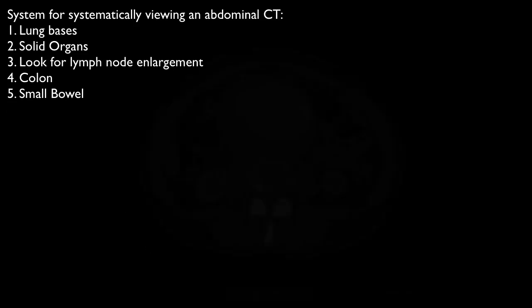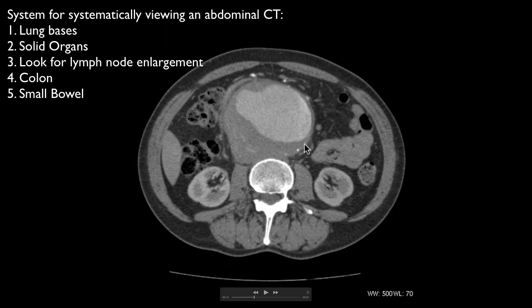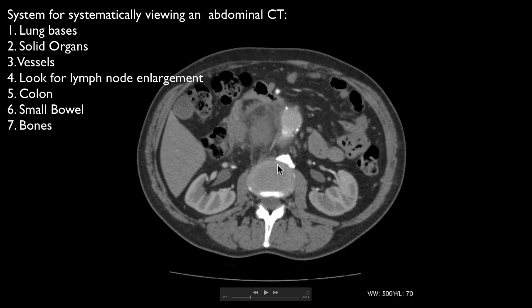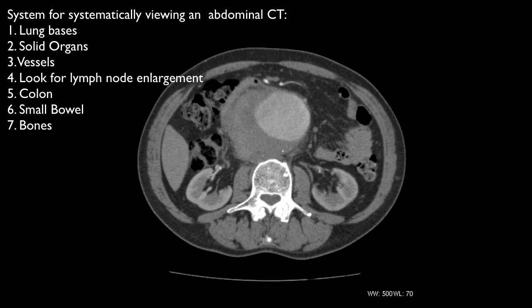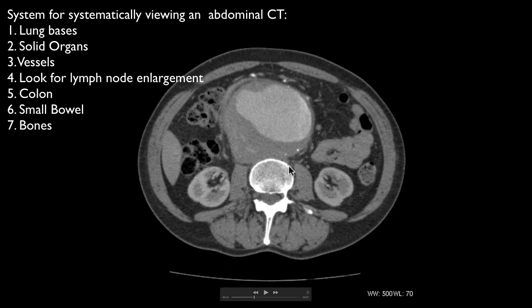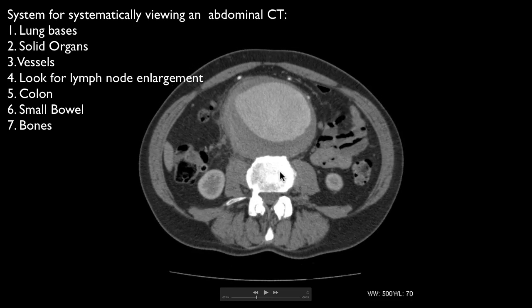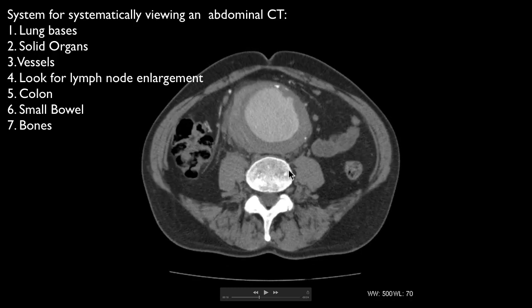You can give oral contrast for CT, and if you get good small bowel distension, you can get really nice pictures for the CT. So last of all, after I've looked at all the bowel and the nodes, I then go back and look for destructive bony lesions. And again, sagittal and coronal views, so side-on and front-on views, are really nice for looking at the vertebral bodies. In particular, that'll show you if there's any wedge fractures or anything like that. And obviously we'd also change our windows to bony windows, which show the bones a bit more nicely.